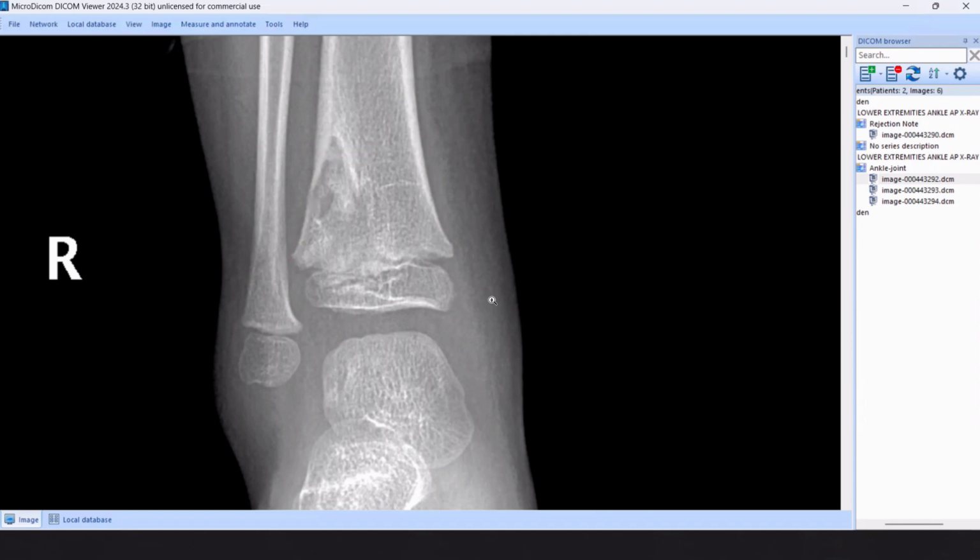I would like to mention that for this lesion, the first possibility is Brodie's abscess. The other remote possibilities may be histiocytosis, maybe metastatic lesions. Sarcomas are a little bit far away, but I think the most logical diagnosis in this case is Brodie's abscess and osteomyelitis. Okay. Thank you so much.